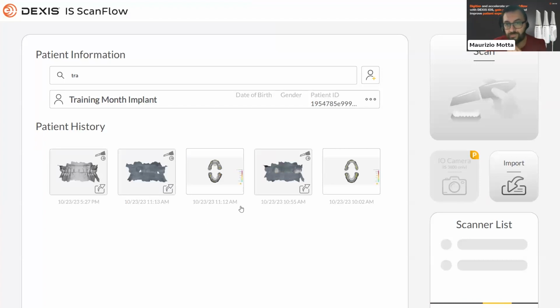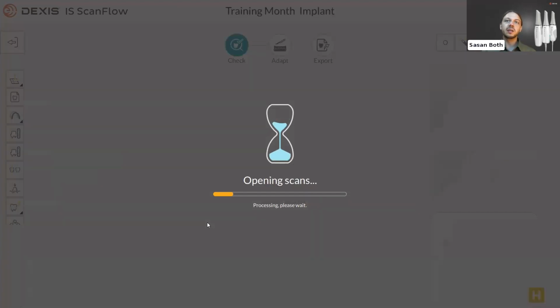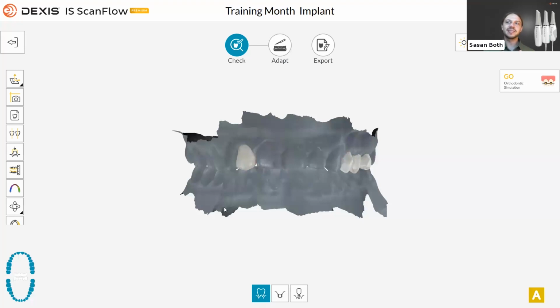So regarding the triple implant scan, one thing we should keep in mind is that if you go with the ideal scenario of using an initial scan with the temporary bridge or crown, and having a more evenly spread out bite, or occlusion, then with the actual final work, which honestly, especially if dental technicians create it by hand, is really a work of art, it's a shame to have to reduce much more of that tooth, or even polish other occlusal surfaces of other teeth that are otherwise healthy and would have had a normal contact had you done it differently. So it's a good feature.